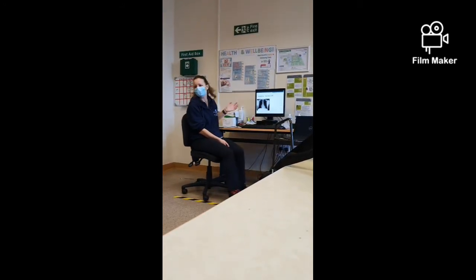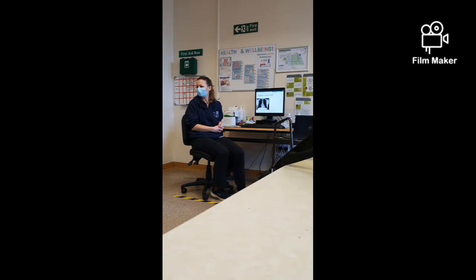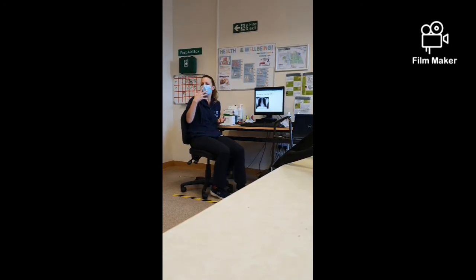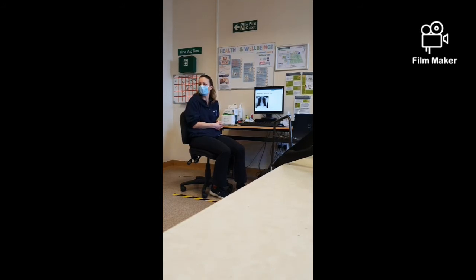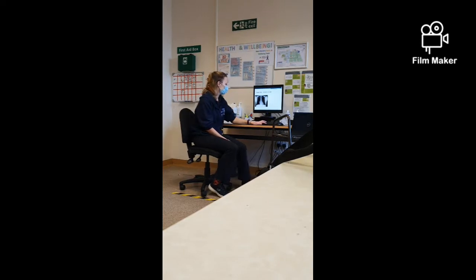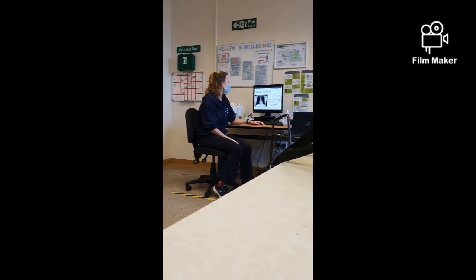All right, so let's look at the normal anatomy. So that is a normal chest X-ray. Everyone happy with that? What can you see on that chest X-ray? Shout out. Tell me what you can see. Heart borders, yeah. Diaphragm. Ribs. Excellent. Anything else? Clavicles. Fab. Okay.